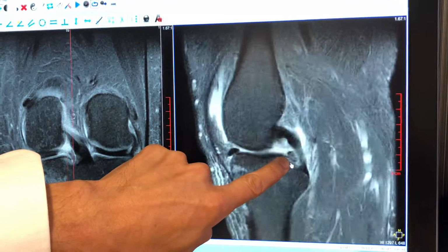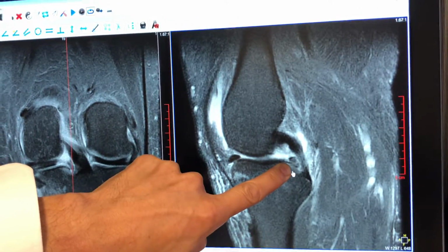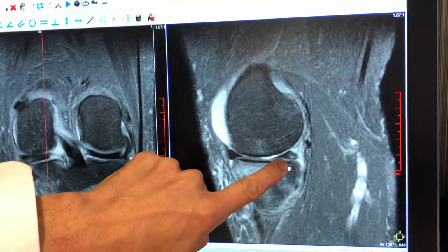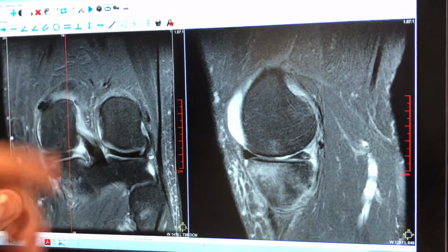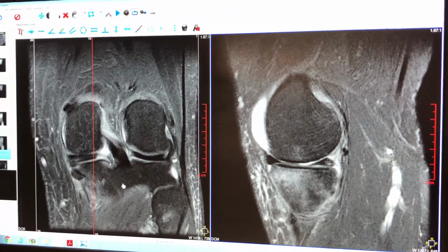So it's like a phantom meniscus sign. That's what we call this, or disappearing meniscus sign. But basically, it's a classic for a root tear. Once again, it's there, it's gone, it's back. Okay? So whenever, once again, history, 50-year-old person, axial force, downward, a lot of pain afterwards. And if their x-ray doesn't show much arthritis, sometimes it does, then high likelihood root tear.